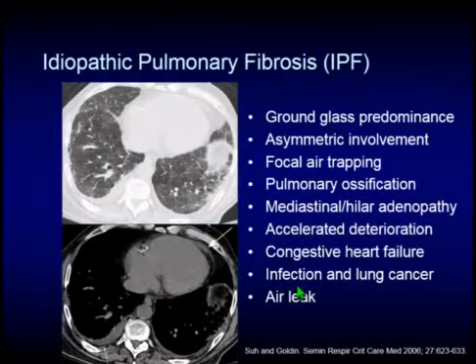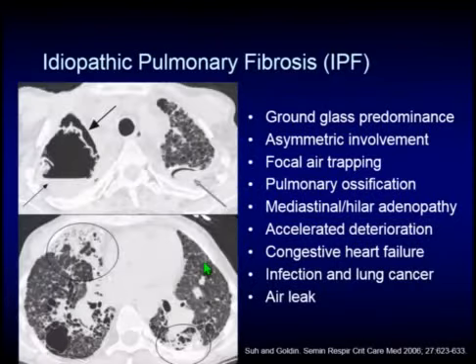Sometimes when you're dealing with patients with very diffuse lung disease, common diseases are very difficult to tease out. In this situation, the only clue as to the diagnosis is the astute observation of small symmetric pleural effusions that you can see. And this was a case of somebody with idiopathic pulmonary fibrosis with a congestive heart failure exacerbation represented by the pleural effusions and small pericardial effusion.